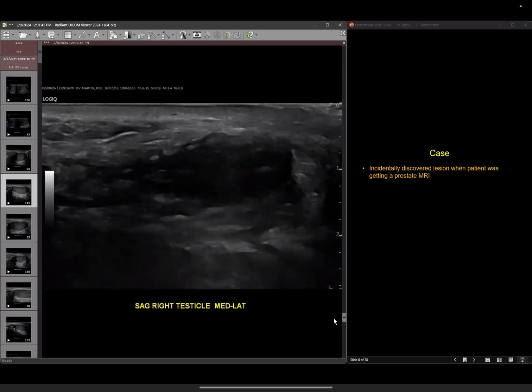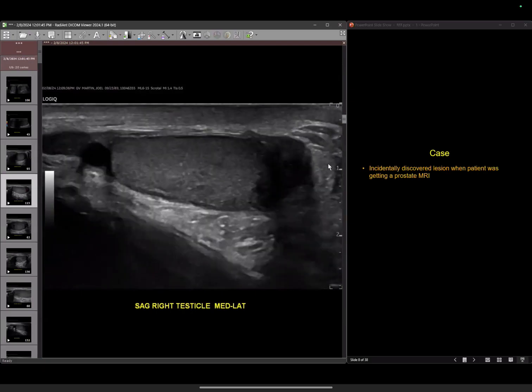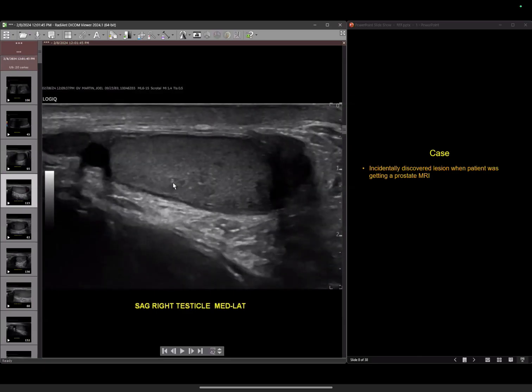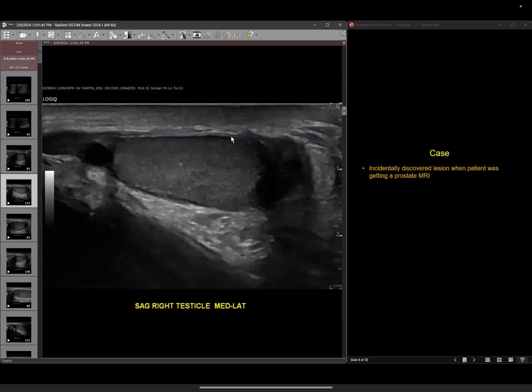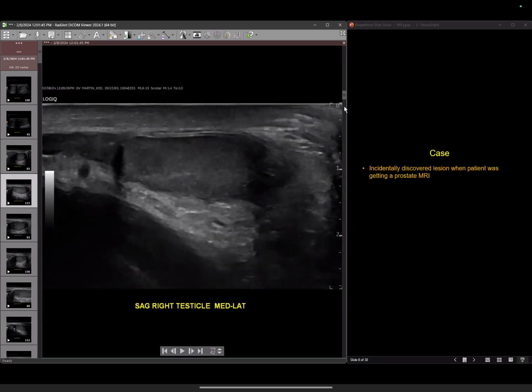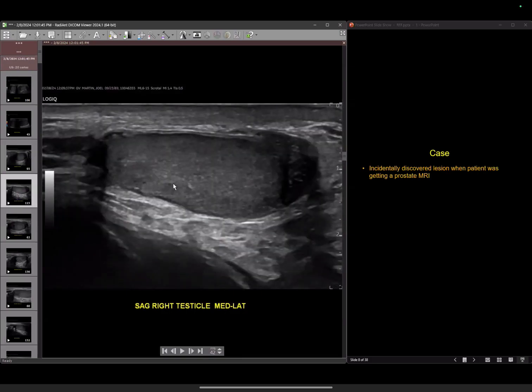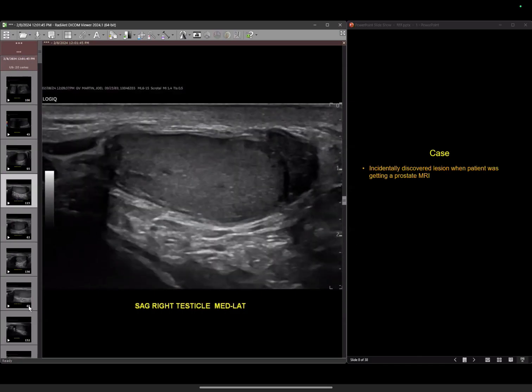So there are multiple echogenic foci. So the question is, distributed. Yeah, these are talking about these areas right here. Yeah, apart from microlithiasis, or what about this area? Remember on MR, the finding was multifocal hypoechoic areas, yes, right? Or sort of hypoechoic area. Okay, so that's the right side.